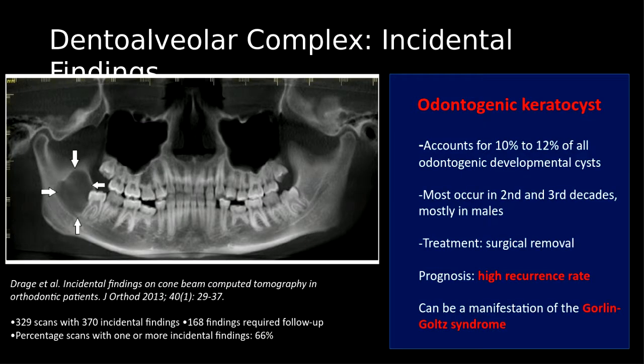So now another one we are going to talk about is CBCT being used in our clinical practices. When we took the CBCT scan, just next to number 32, you can see a well-defined scalloping kind of lesion, which is pushing the tooth a little bit more medially. But it's not really resorbing, and the canal is displaced slightly inferiorly, but not too much. So this kind of thing, we call odontogenic keratocyst in the first differential diagnosis, and it makes up about 10 to 12% of odontogenic cysts.